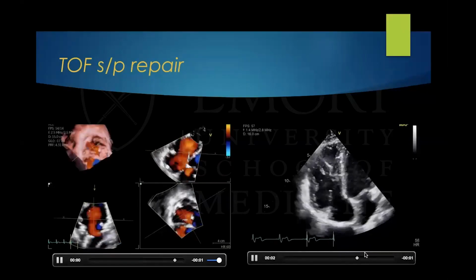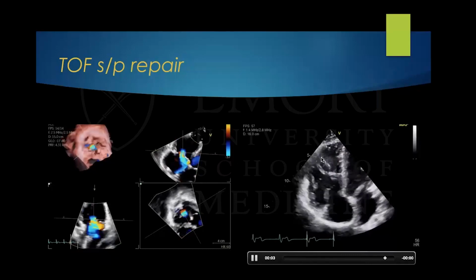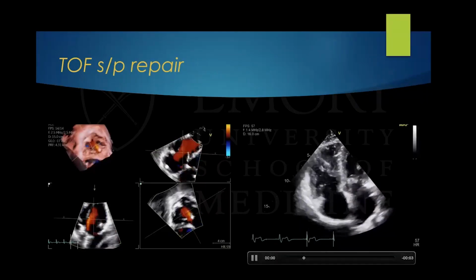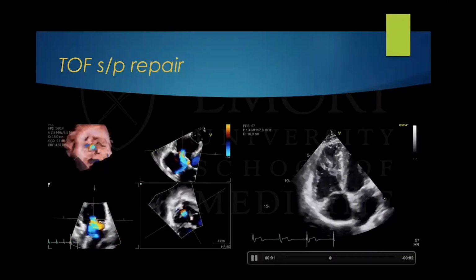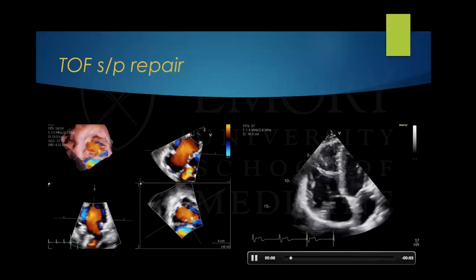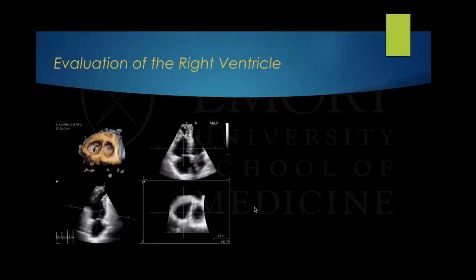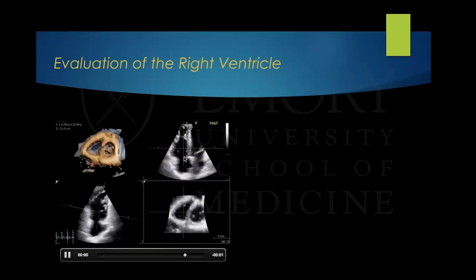Now, in the apical four-chamber view, you're going to see that the right ventricles are dilated, and the function can be normal or decreased depending on how the myocardial function is in these ventricles. This one actually has preserved ventricular function. So the right ventricle is dilated, but we underestimate the volumes because we're using only one plane, the four chamber, like you see here.